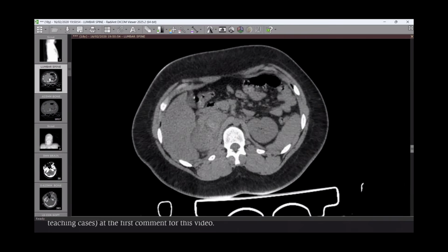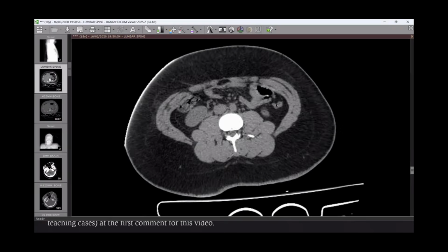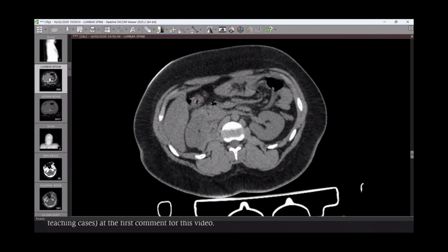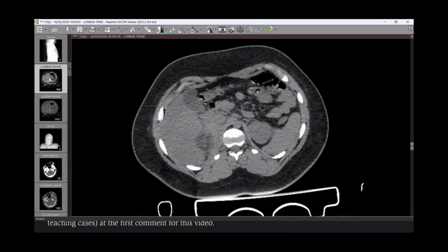I'm helping you to save your time, but you are going very smooth and perfect. Also in the retroperitoneal region, the ascending colon appears normal. So I think this is the main abnormality, with fat stranding surrounding this collection.